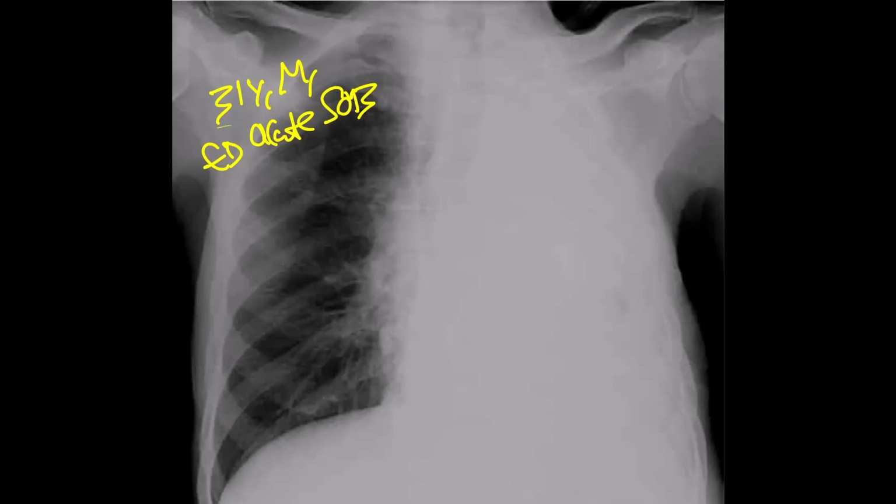So this is a 31-year-old male patient who presents to the ED with acute shortness of breath. You have considered the 4 differentials, but one of the most important factors you need to see is whether the trachea is pulled towards the site of the total lung whiteout, and that gives you an impression that this is an atelectasis. Another thing that you can do in the ED is a lung ultrasound, and that can differentiate easily between atelectasis and massive pleural effusion.